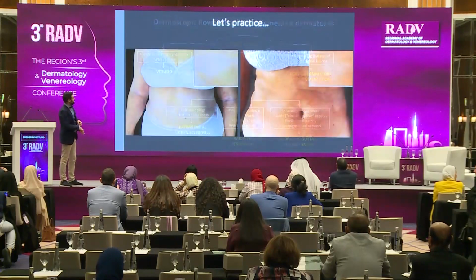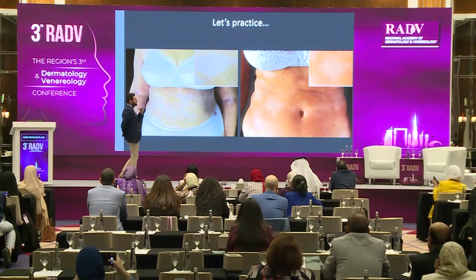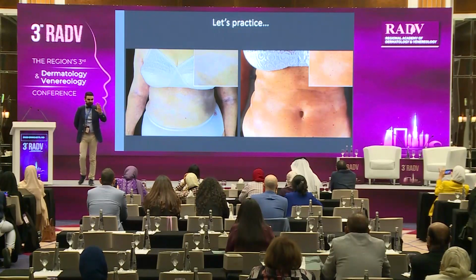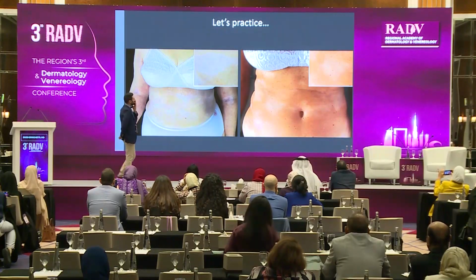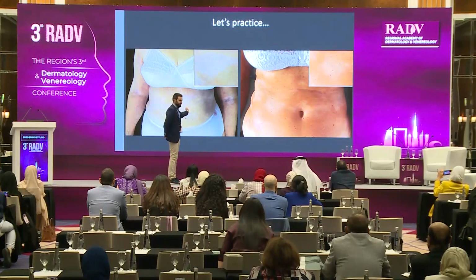Okay, let's see some examples. Now, can you tell me which one is vitiligo? This one. Do you agree? Yes, this one. Do you agree? No, okay. Okay, this is not vitiligo. What is this?